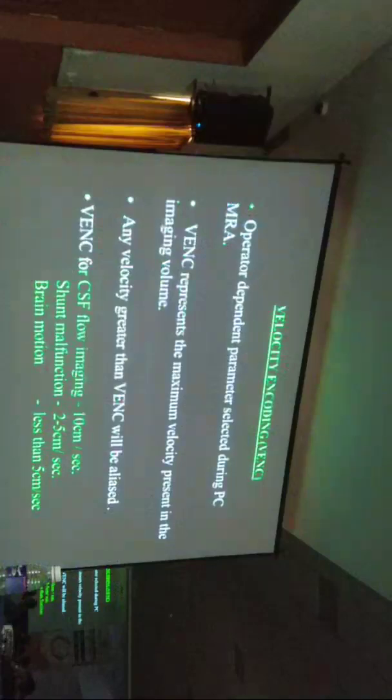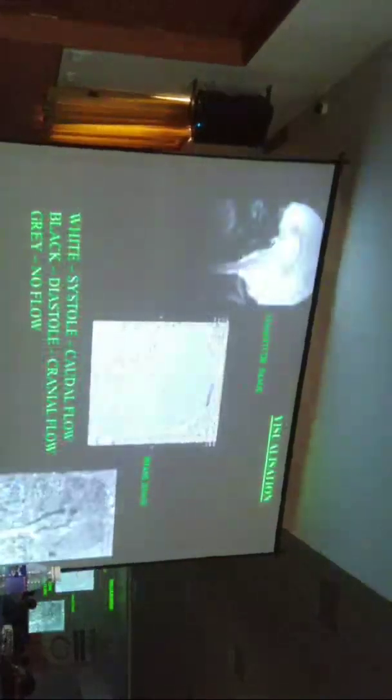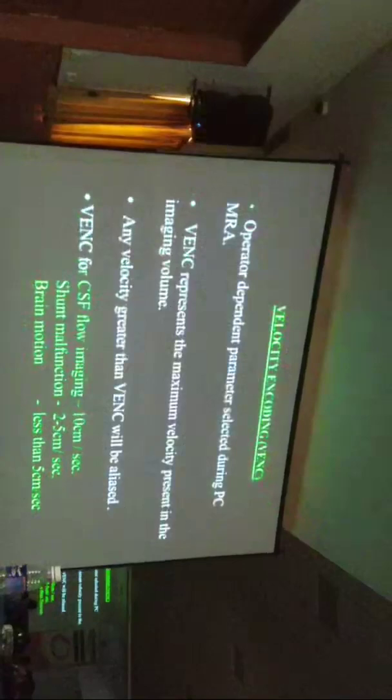And the technique that you have to write is that this is done with a sequence called phase contrast MR imaging. So this is the phase contrast image. Probably you have come across this phase image in SWI. Similarly, you may see this imaging in the cardiac. You may get it in phase contrast angio. So all are similar sequences. So these are all called the phase contrast CSF flow imaging.